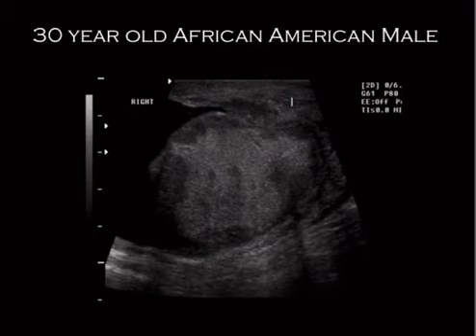Okay, so here's some trickery. A 30-year-old African-American male. I've mentioned both age and race, so that should set off your alarms. And we can see that he's got multiple hypoechoic masses. But I said that it's young white guys that get testicular cancer.